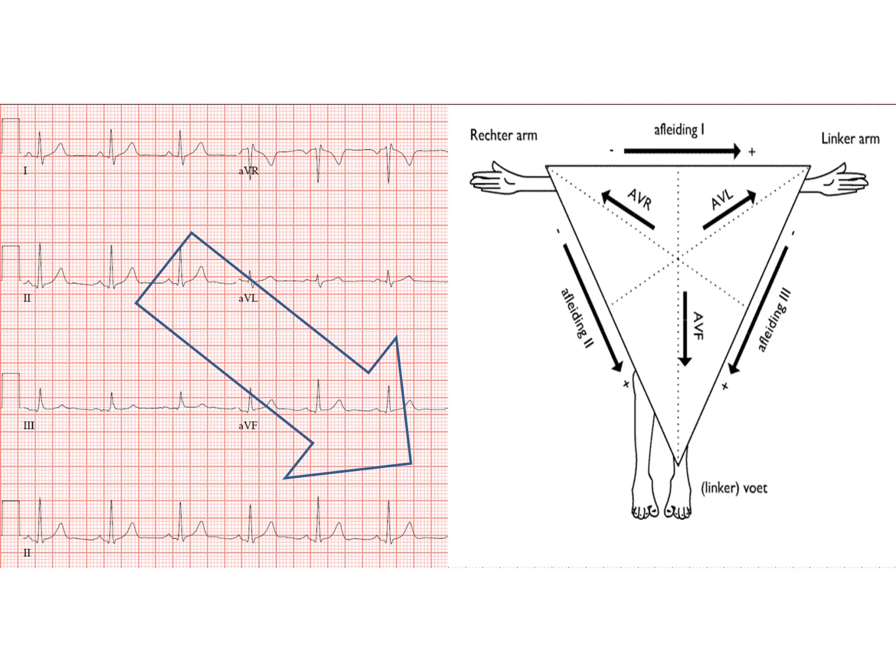Now, let's compare lead 2 to lead AVL. Again, remember, lead 2 looks down and left, and lead AVL looks up and left. So both of those leads will turn positive if the electricity is going leftwards in the horizontal plane, but there will be a difference between them caused by the fact that 2 looks downwards in the vertical plane and AVL looks upwards. In fact, the entire difference between the two will be explained by what's happening in the vertical plane. So let's look at the two of them and decide which one has more positive deflections. We'll see very quickly it's lead 2. So right away we know that the electricity is going down and towards the left.